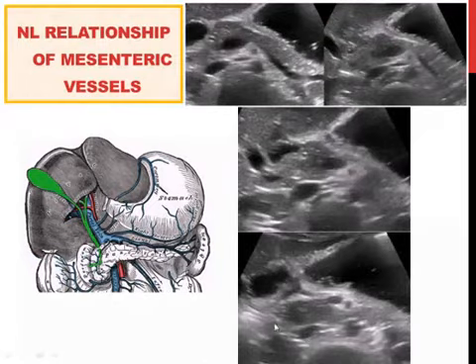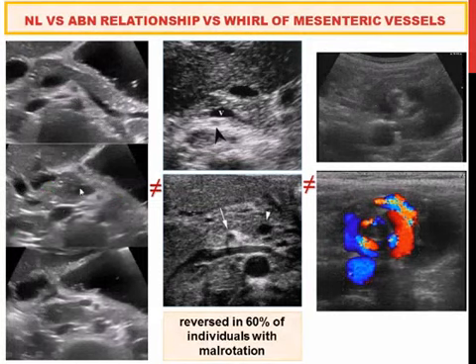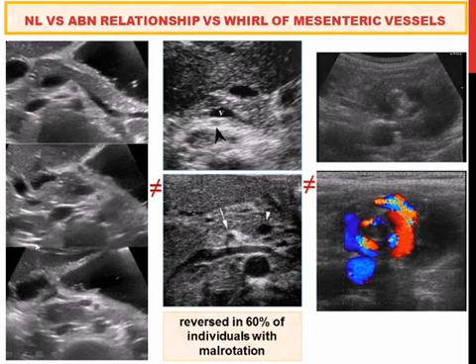We should be familiar with ultrasound and the normal relationship of this black dot, which is the superior mesenteric artery, and over that is the splenoportal axis, but further down this turns into the superior mesenteric vein. This normal relationship of the vein being anterior and to the right of the artery is what we should see.